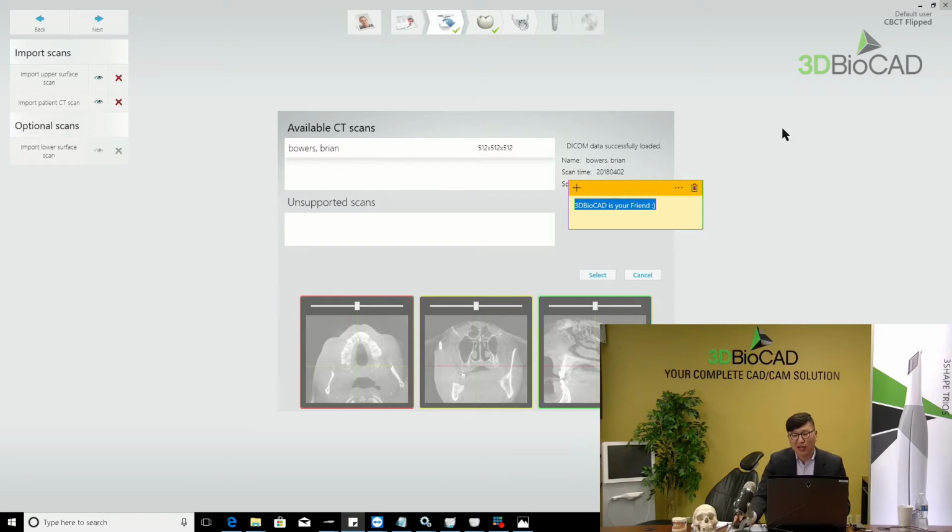Okay, so I just showed you two things about the CBCT. Please remember that, and it will be helpful if you have Implant Studio, or if you will have Implant Studio. Let me just bring this down.